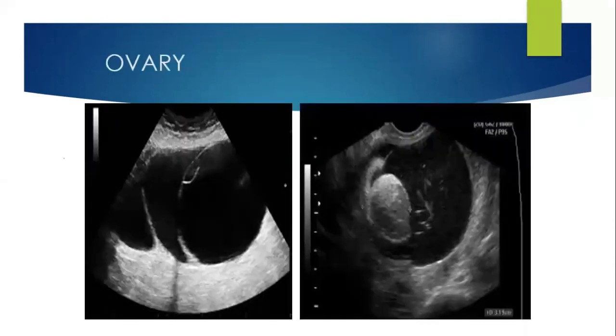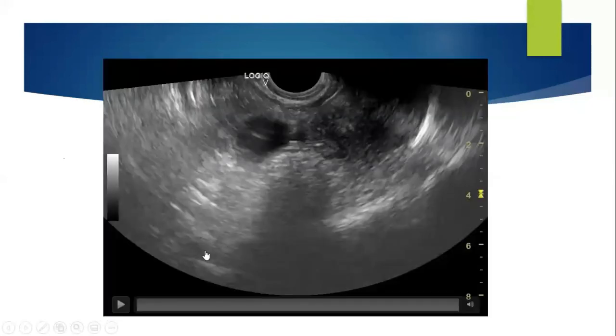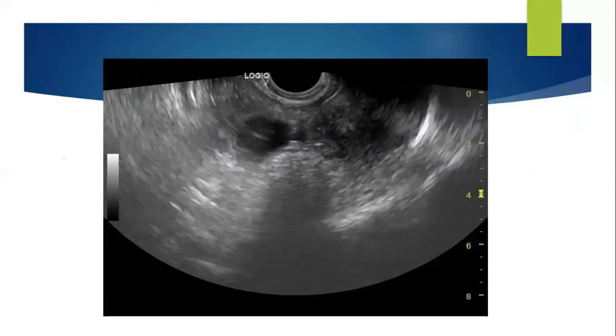So these pictures give you some idea of benign ovarian cysts, and this is a typical picture of a dermoid where you see a cotton wool-like appearance. And this again we'll be discussing in our next classes. Now I'll be showing you certain videos to look into it.